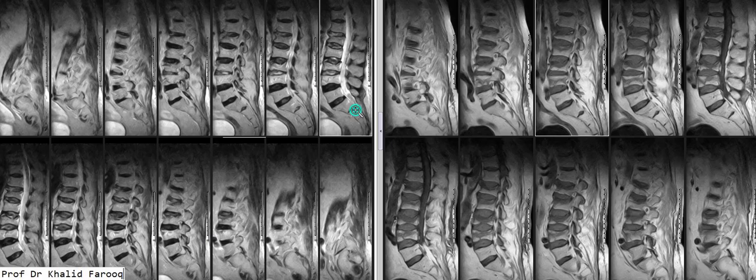Number one, we have ruled out multi-level infection, and we have concluded that the changes in the upper four lumbar vertebrae are because of old osteoporotic compression fractures. Overall, multi-level degenerative changes are also appreciated at all disc levels. Minimal degenerative narrowing of the exiting neural foramens is noted at L2-3, L3-4 and L4-5 levels. The conus and adjacent lower dorsal cord are unremarkable.